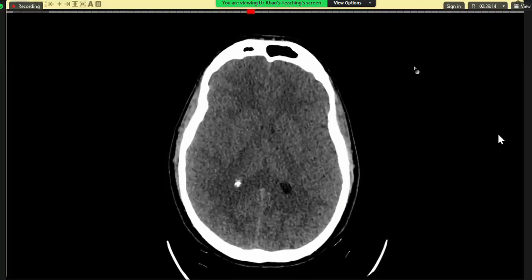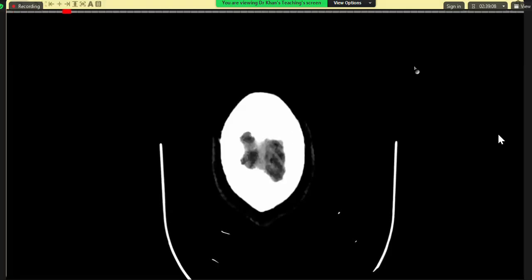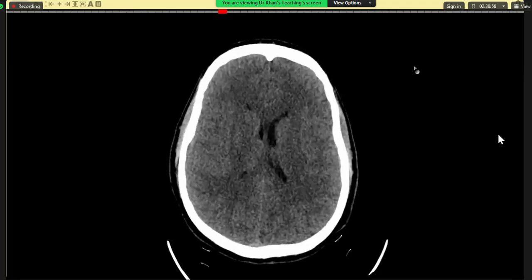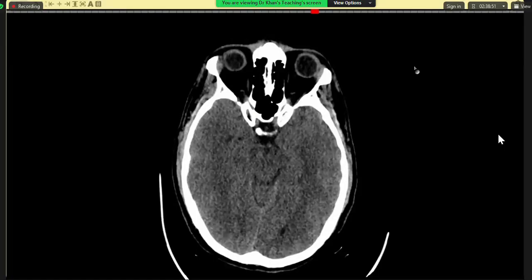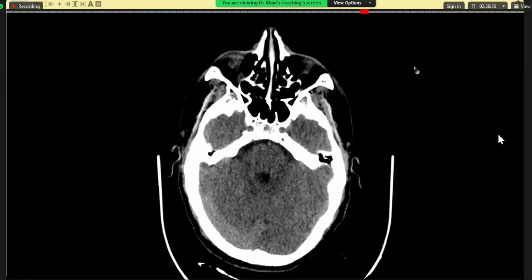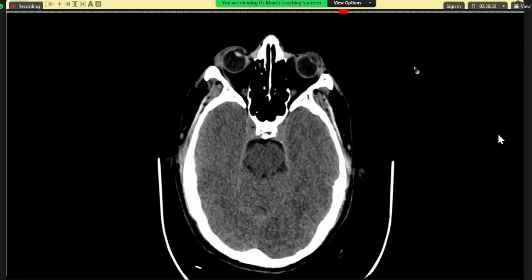So this is axial CT brain imaging in a patient who presented in A&E with emergency symptoms. I would like a moment to go through the entire stack of the images and then I will start commenting. So my first observation is that in this plain study, there is a heterogeneous density lesion seen in the right temporal lobe with hyperdensity in its margin. Lesion is well defined, no associated edema, and a focus of hypodensity within it, also leading to an air fluid level type of thing.